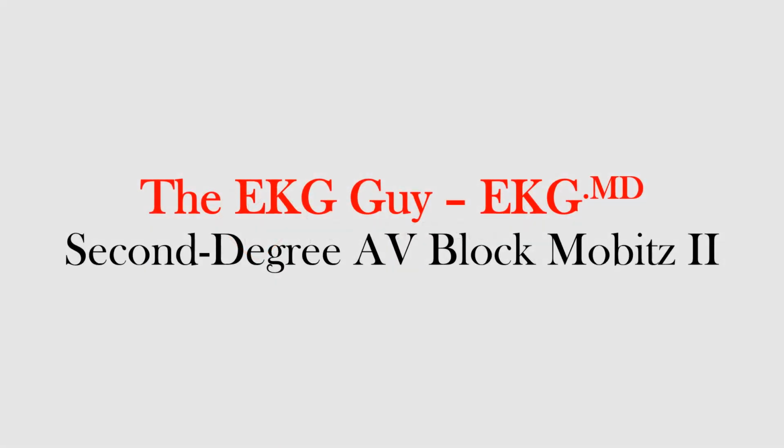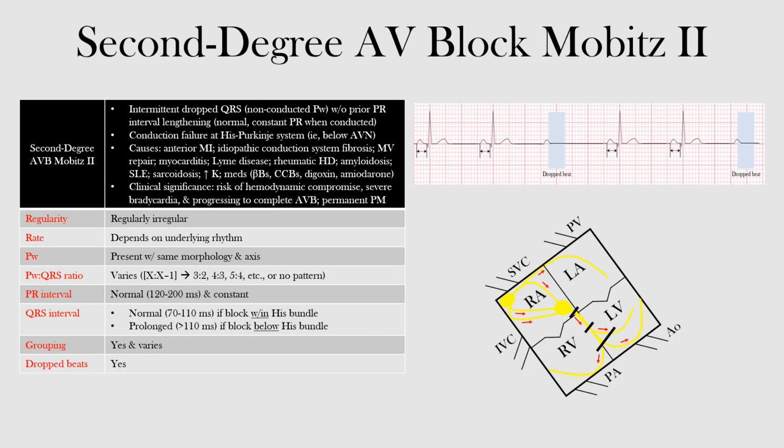In this lecture, we will discuss second-degree AV block Mobitz type 2, including its mechanism, EKG features, potential causes, and clinical significance. Second-degree AV block Mobitz type 2 is characterized by intermittent non-conducted P waves without prior PR interval lengthening. In other words, there are normal constant PR intervals when the P waves are conducted, and then all of a sudden there's a dropped beat.